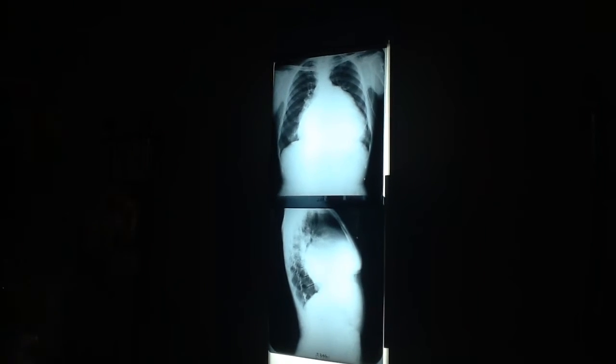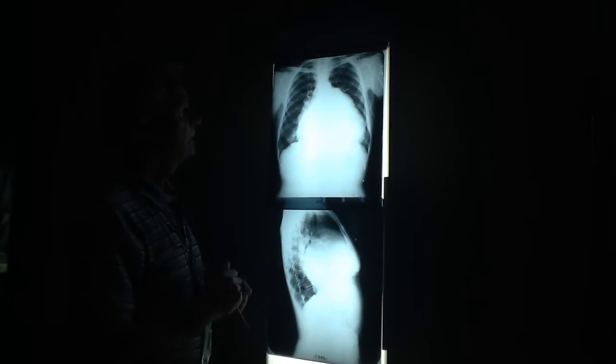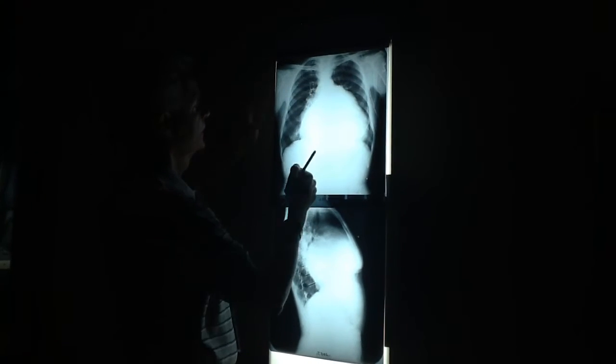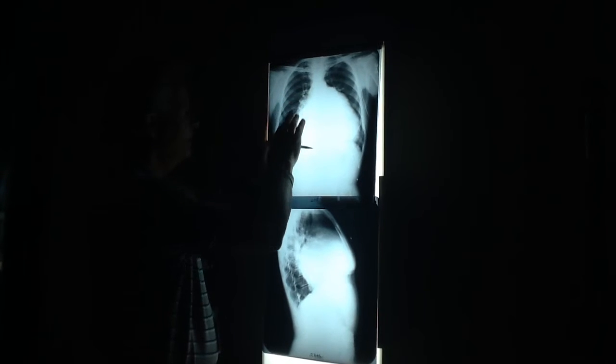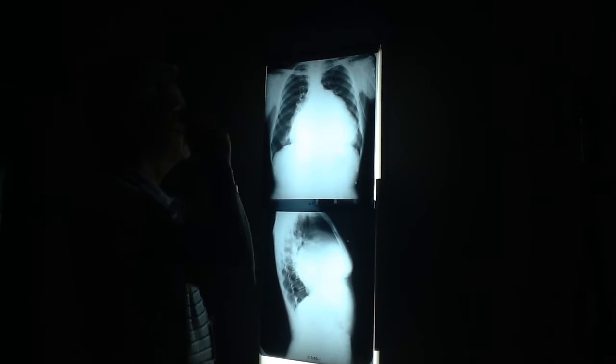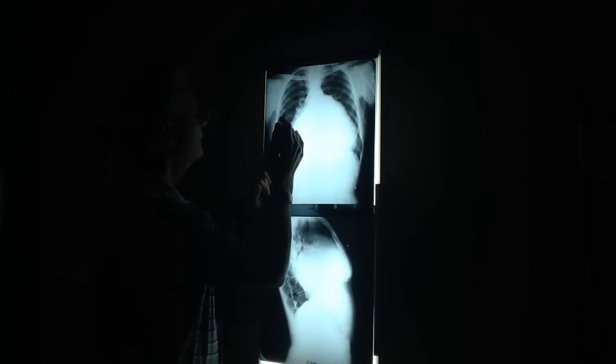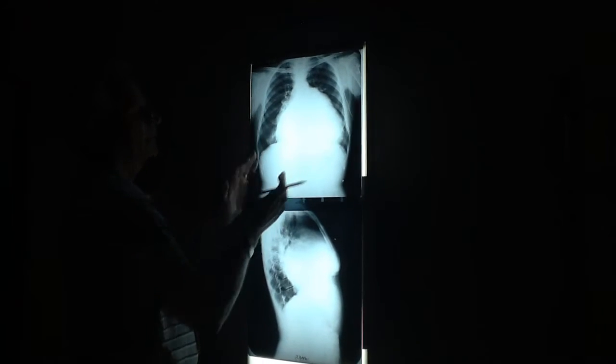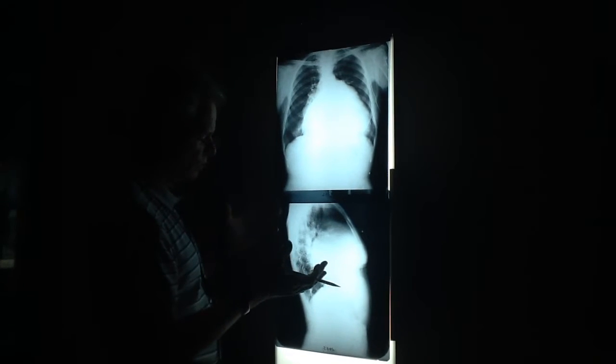So how did the mitral valve do that? Cor pulmonale? No, not really. There is some prominence of the upper lobe veins, though. Maybe a little bit of edema, but not really very much, if there is. There is some prominence of the hilar areas, but a lot of this is getting covered up by the heart, isn't it? Things grossly enlarged.